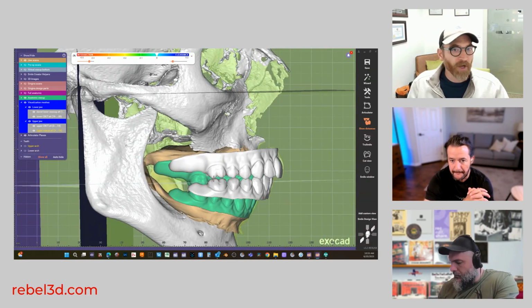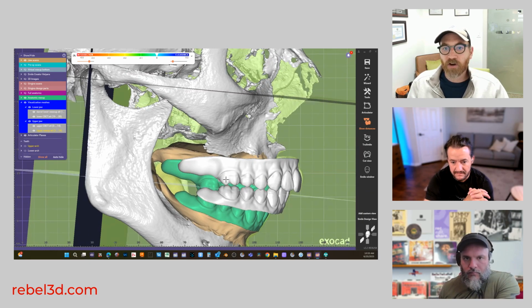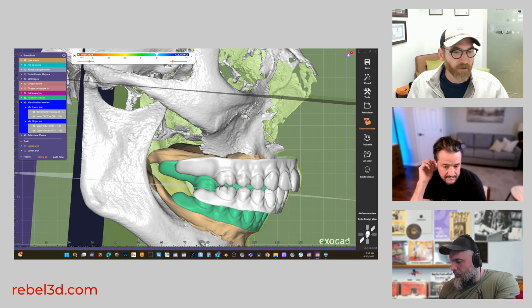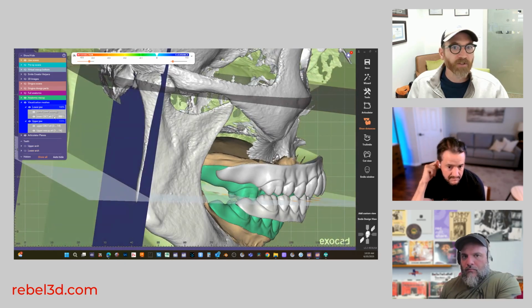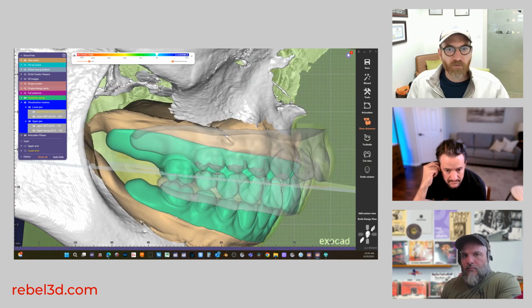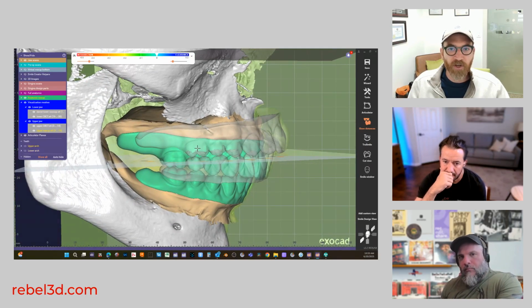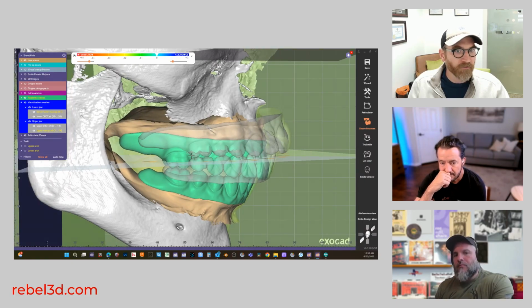So let's say we open the bite 3 millimeters, okay? And you'll notice that these molars are further away from the hinge axis than the green ones. So we're going to make these taller so that they interact, like the green ones. So what we're going to find is when the patient bites down, these are going to hit first, because they were opened and are further away.